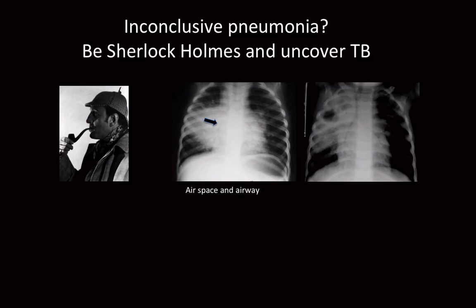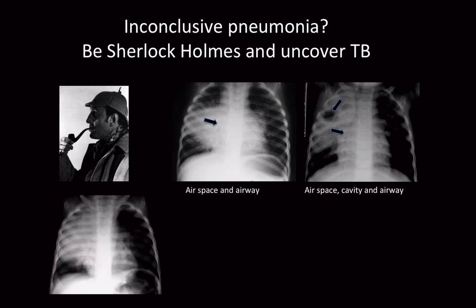Here's another case with breakdown of a parenchymal disease. You look through the density, you can find the bronchial compression. Again, you may be attracted to look at the airspace disease, which is bulging and exudative. If you look through, you'll see the bronchial compression. In all three cases, you know this is tuberculosis because none of the other bacterial pneumonias do that.